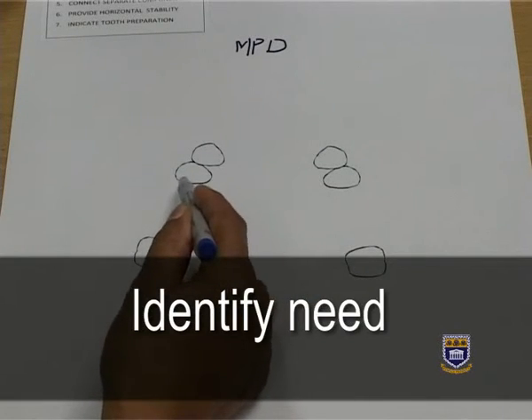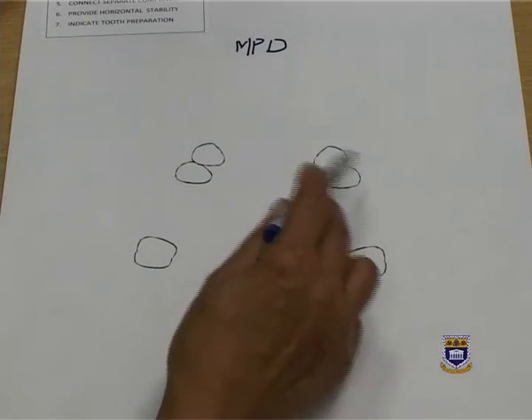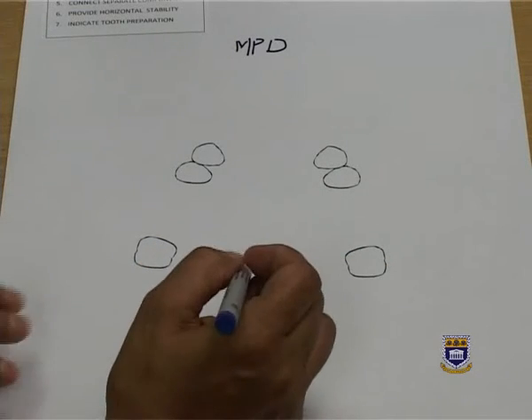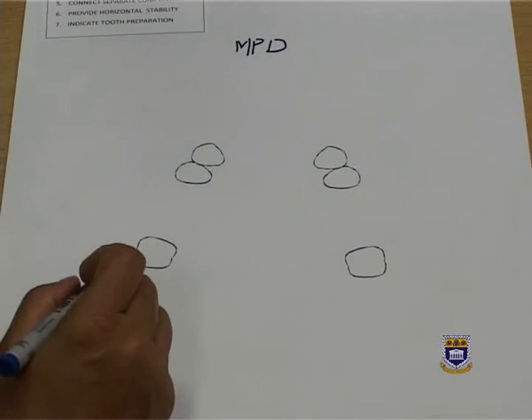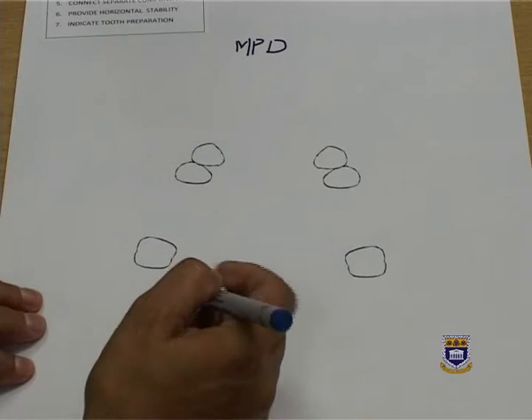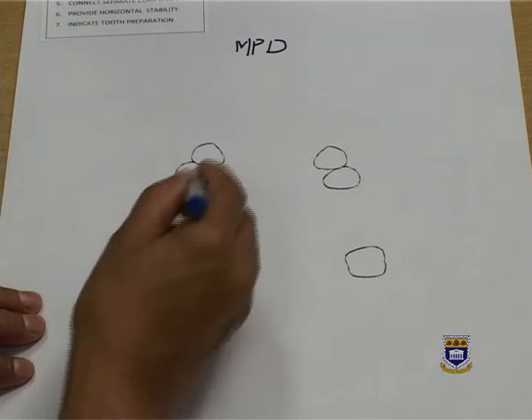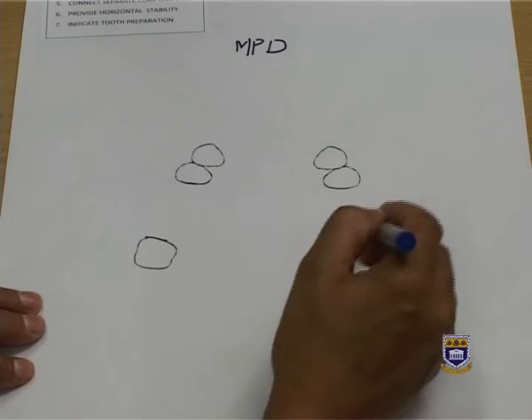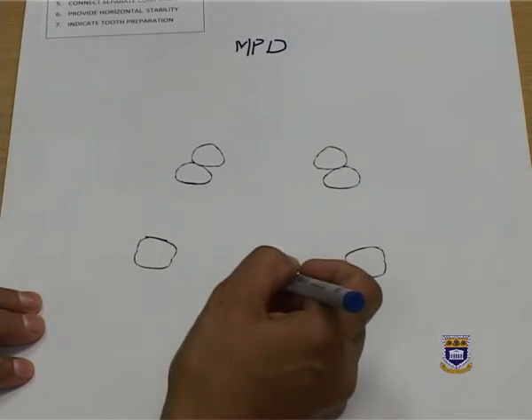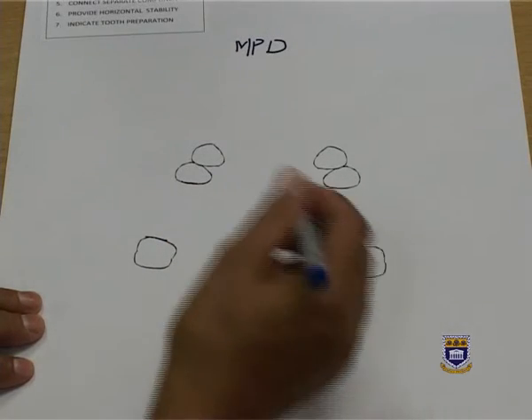As always, follow the steps to identify the need, where I have indicated the teeth that I'm going to replace, my guide planes, I've surveyed, and I found my undercuts. I will follow the support and retention as for all designs. We'll follow the 7 steps to make sure that I provide the patient with a biologically acceptable denture. My guide planes will be where the denture is in contact with the abutment surfaces of the teeth, and guide planes provide passive retention. So the denture and the tooth fit snugly against each other.